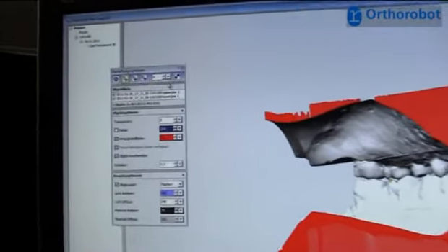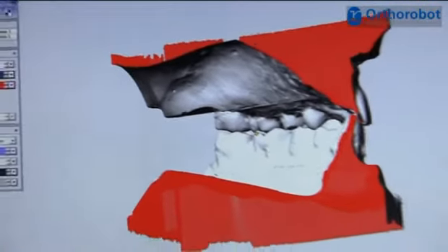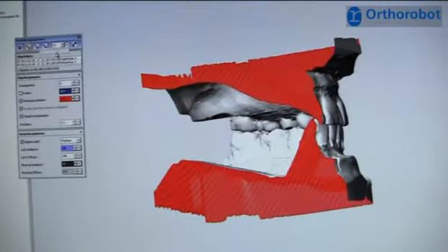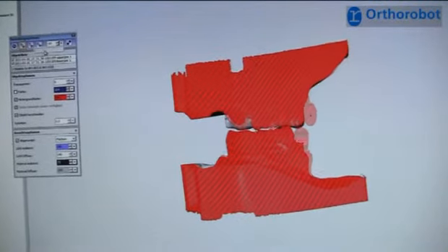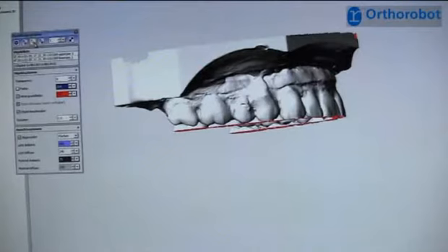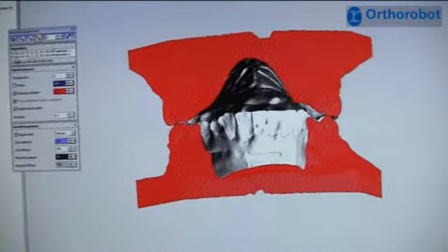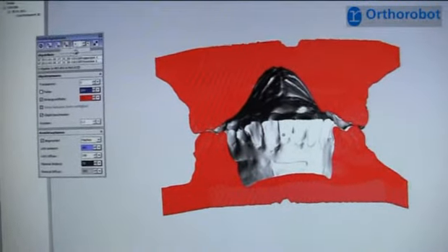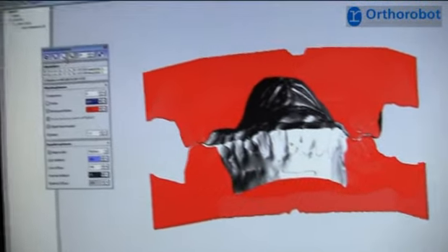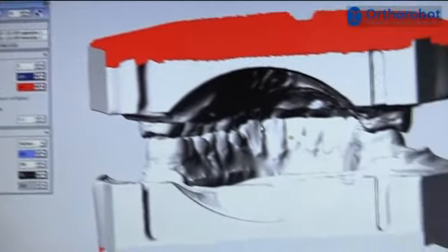You can also move these planes through the model by clicking and holding the arrow next to the buttons and moving the mouse to the right and left. The same is possible for the Y plane and the Z plane. And the leftmost button resets the model to its original state.